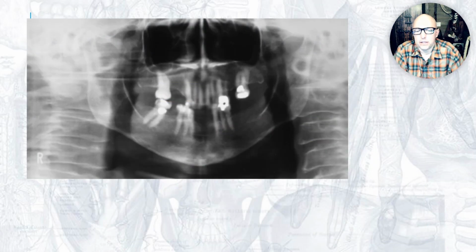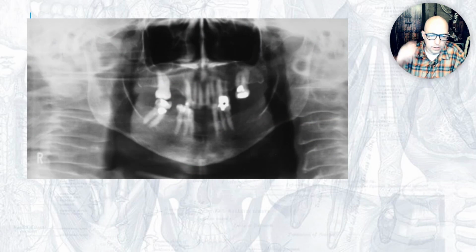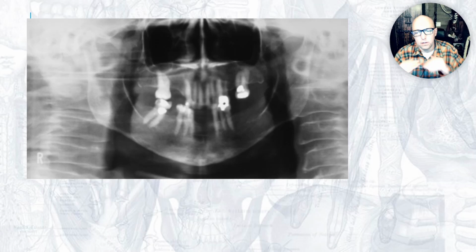And so I'll test you on these now. What's going on here? Is the chin down a little bit? That's not the primary problem. Yeah, there's a little bit of a smile line. Look at the anterior teeth, and think about what's causing the spine to look that way. I see way too much of the spine. Those are real images. In a lot of cases, the spine looks pretty unfocused, but these are kind of blurred.